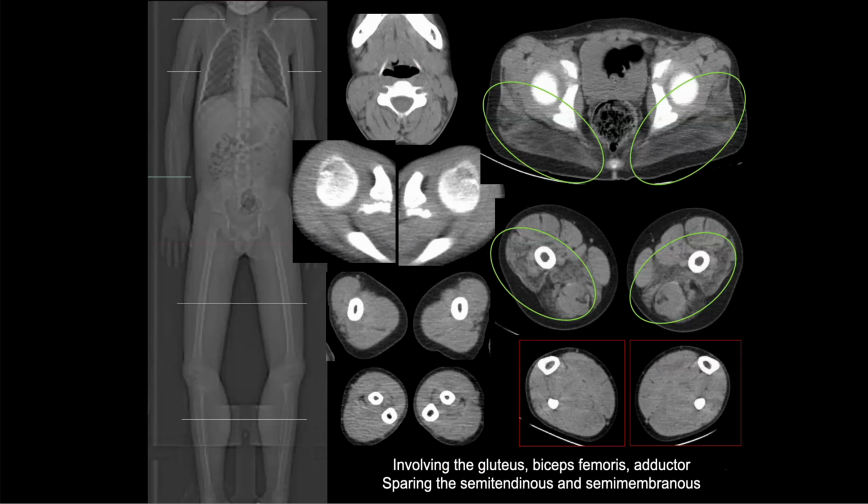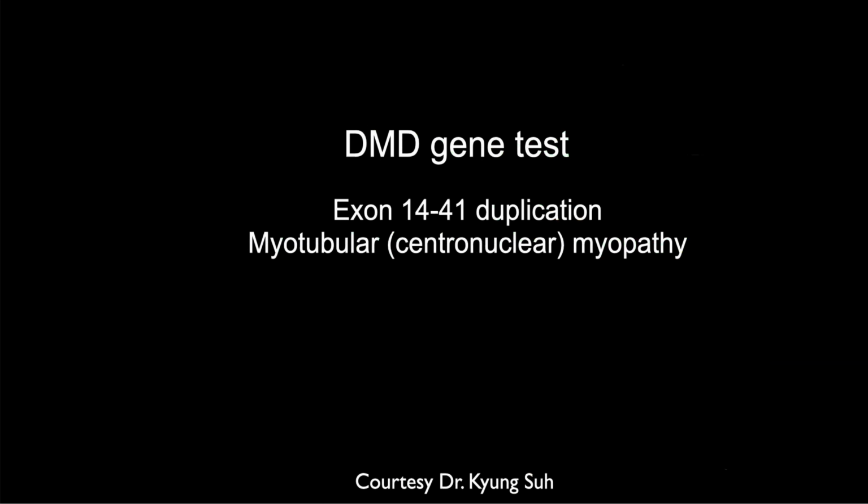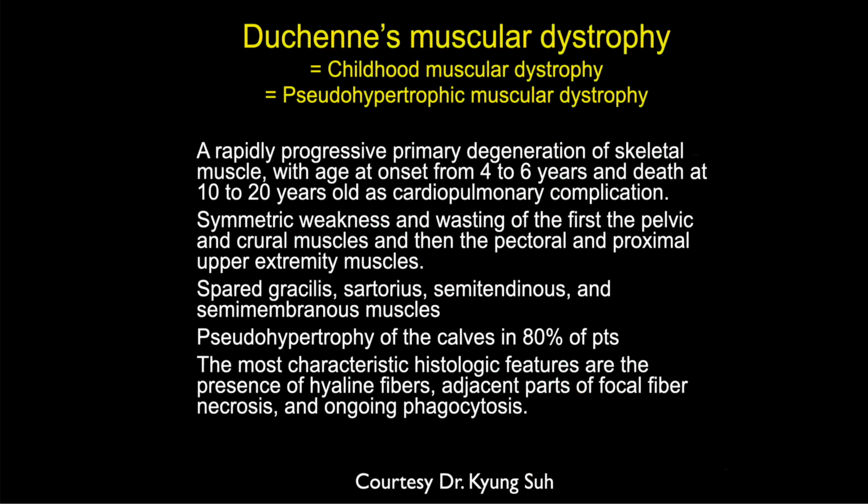Here in the legs and gluteus maximus, there's a fair amount of atrophy. And so this again looks like it's probably going to be some kind of congenital syndrome. And then it was, by genetic analysis, one of the many causes of Duchenne's muscular dystrophy.